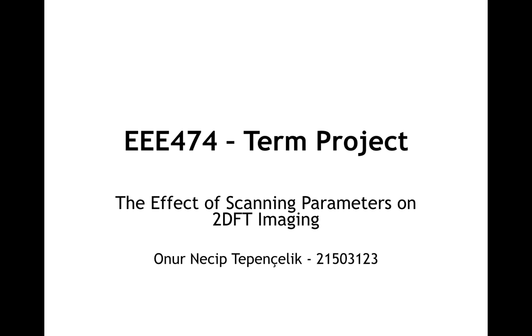Hi, I'm Onur Tepençelik and this is my term project for EEE474. In this project, I explored the effects of MRI sequence parameters on image reconstruction. I will demonstrate different weightings on the image object, such as T1 weighting, T2 weighting, and proton density weighting. I will also show the effect of resolution and field of view on the reconstructed image.